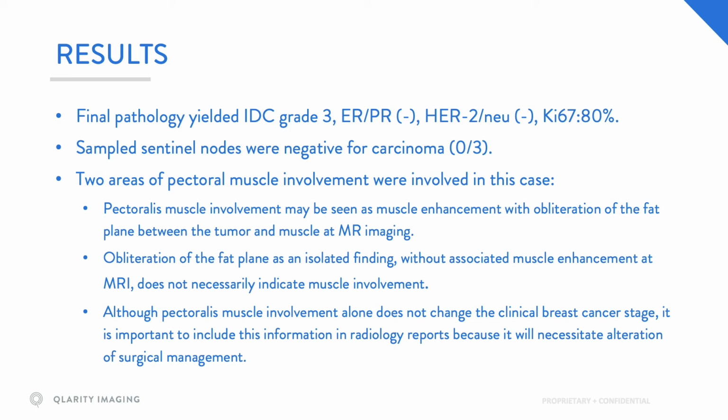And although pectoralis muscle involvement alone does not change the clinical breast cancer stage, it is important to include this information in the radiology report because it will necessitate alteration of the surgical management, and some surgical excision of the muscle enhancement may be necessary. So this is important secondary information with regard to this very highly aggressive lesion.